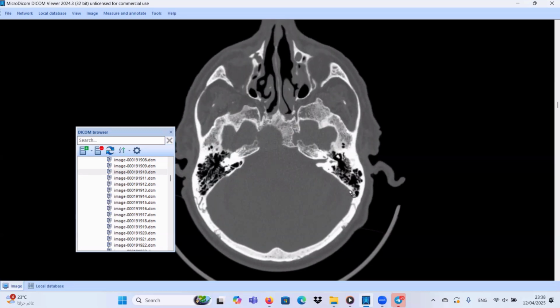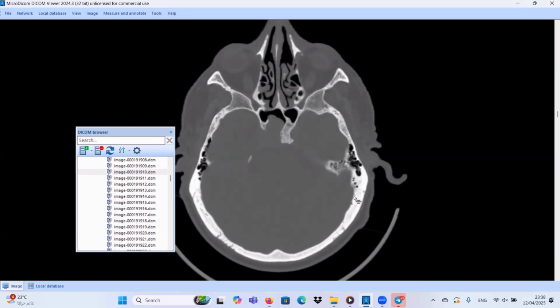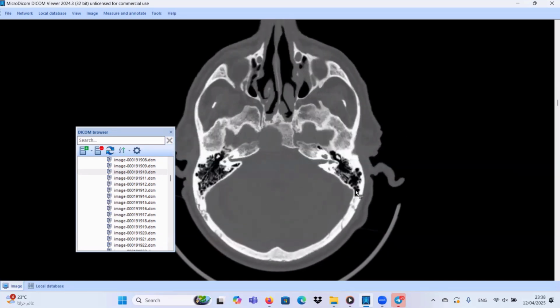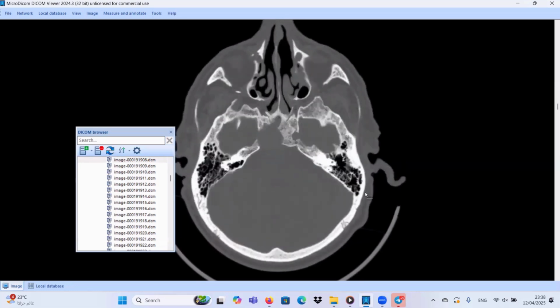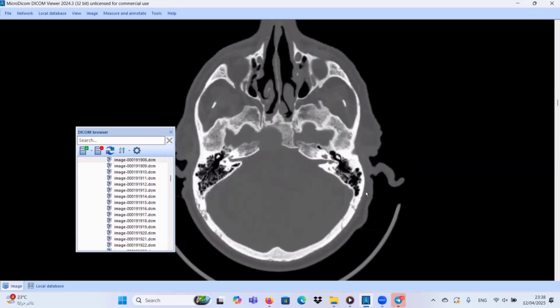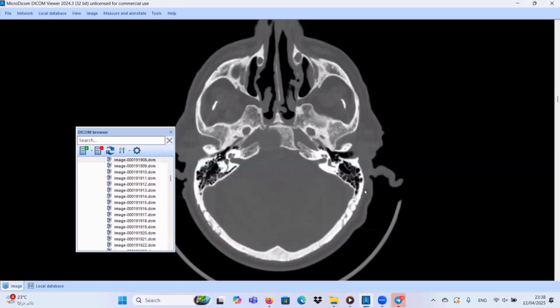You should ask yourself again, is there any chondroid calcification? We don't have any chondroid calcifications. If we have chondroid calcifications in a right paramedian lytic lesion involving the clivus in an elderly patient, chondrosarcoma is one of our possibilities. So again, I think it is not matching with chordoma or chondrosarcoma, but we should also put these possibilities in our differential diagnosis.